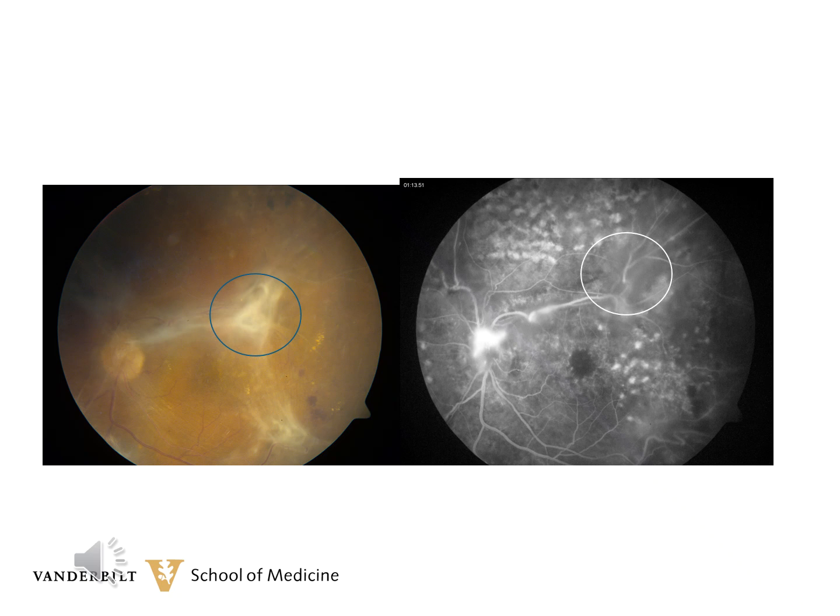This patient has advanced proliferative diabetic retinopathy. As mentioned earlier in the session, diabetic retinopathy is a retinal problem, and any neovascularization or fibrosis will therefore be anterior to the retina. It will not be subretinal. You can see the white fibrotic membrane extending from the nerve along the supratemporal arcade in a very dense area above the supratemporal macula. There's also other fibrosis going down inferiorly as well.